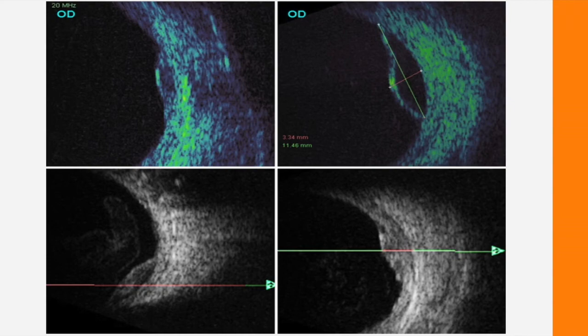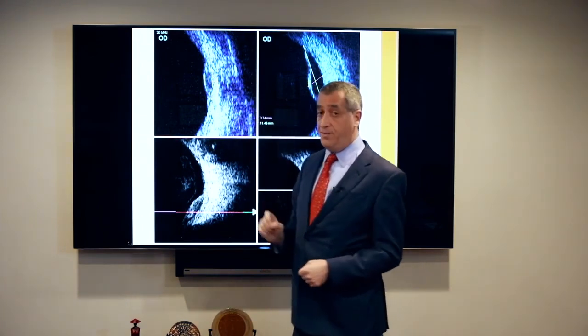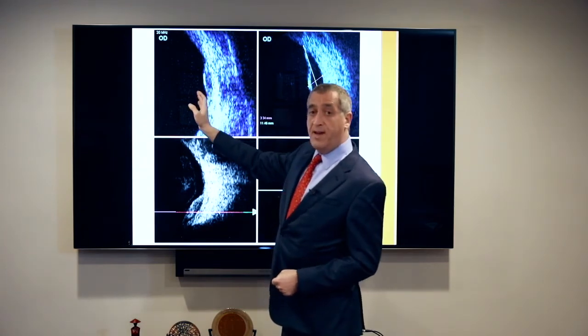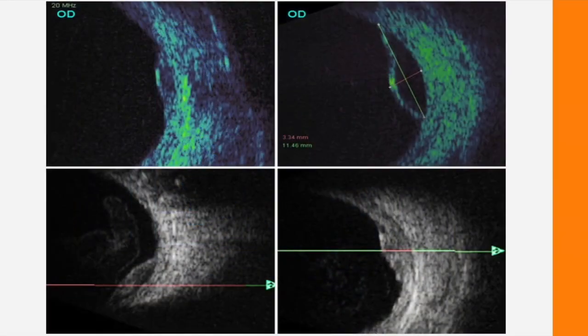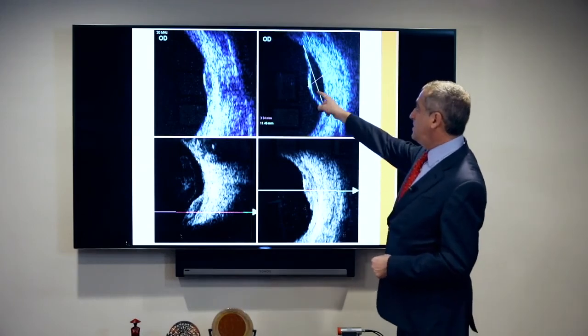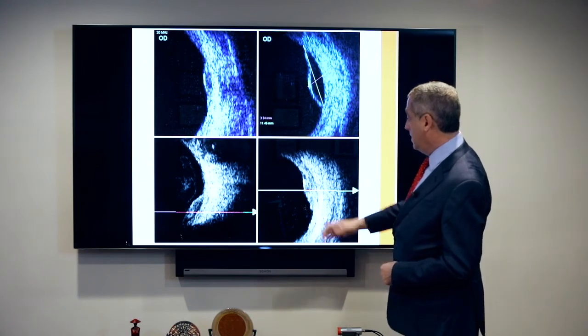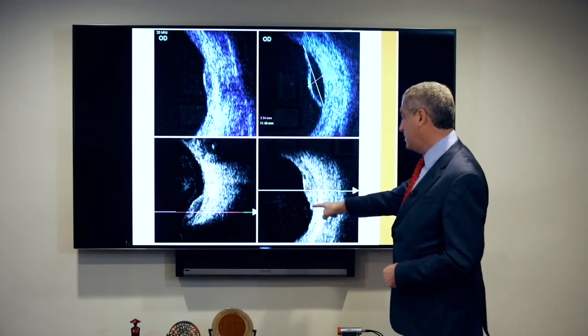One is that the tumor sclera interface is very sharp. You can see that with a number of tumors, but you reproducibly see that with choroidal hemorrhages. Here we have vitreous blood, also a tip-off that there was bleeding. And you can see again that sharp transition between the tumor and the sclera here. Here we have a serous component. This is completely echolucent. And here we have the tumor itself with an irregular surface.